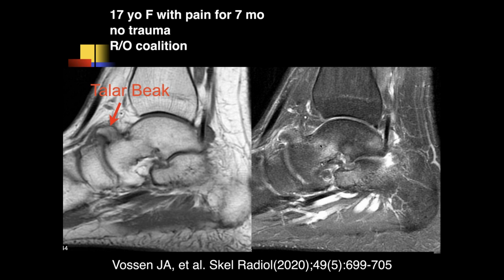That's not a spur. Okay. So this is... It doesn't look like there's any pathology going on there. So it's part of the talus. It's a congenital thing, I think. Don't you, John? Well, I think there are people who consider these congenital. It's called a Talar beak.